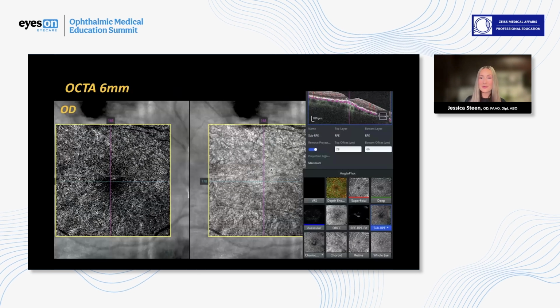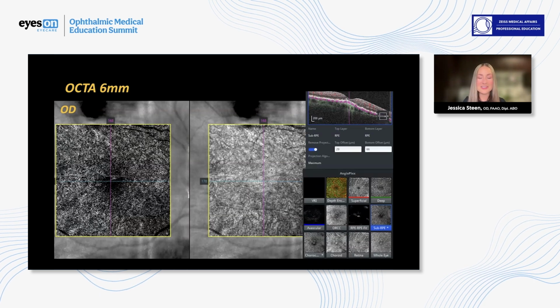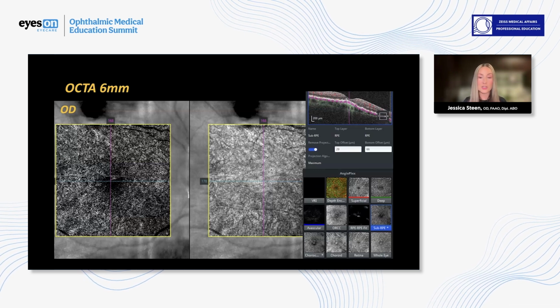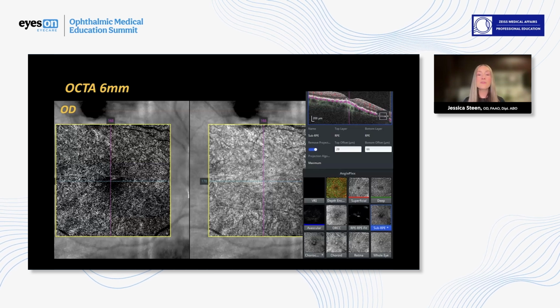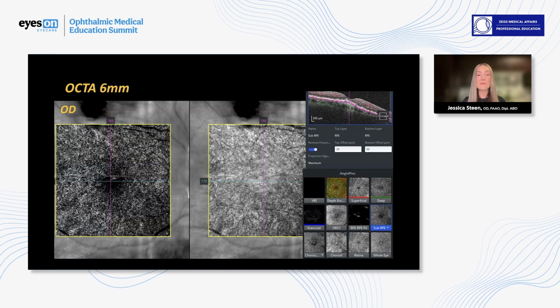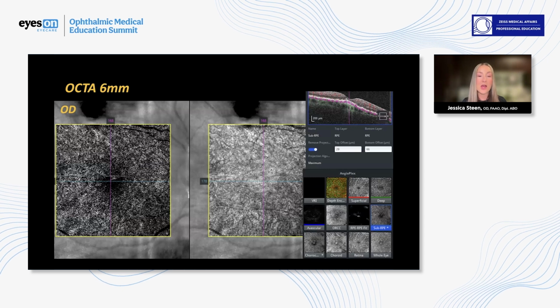Now, as I mentioned, in the right eye, that flat or low-lying irregular pigment epithelial detachment has me very cautious about the potential presence or development of choroidal neovascularization in the macular region. OCT angiography is a really valuable tool to evaluate for non-exudative choroidal neovascularization, or a choroidal neovascular membrane that hasn't yet broken through the Bruch's membrane RPE complex.